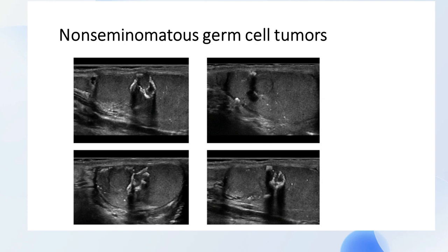Are they intratesticular or extratesticular? When that is done, it will be easier for you to know that most extratesticular lesions are benign, and most intratesticular lesions are mostly malignant or cancerous. So that's the golden rule that you must adopt. Then biopsy can make a distinction.